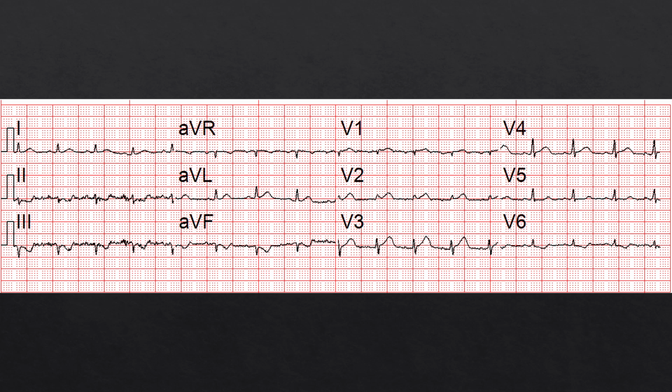So the providers took the ECG, they saw this, and thankfully they caught the warning sign and triaged this patient appropriately to a PCI facility. If you look, using that rule, the T wave should correspond with the preceding QRS. A good example of a more normal T wave is in lead 1, where you've got a T wave that's less than 50% the height of the QRS. It's got a nice gradual ascending limb. It is a little symmetric looking, but overall a fairly normal, benign-looking T wave.